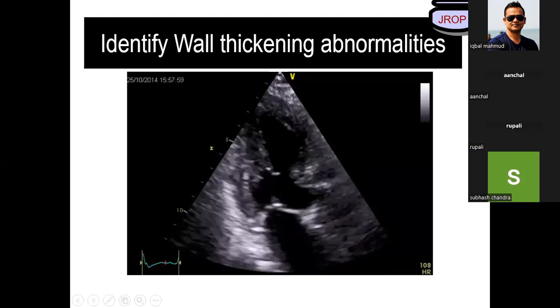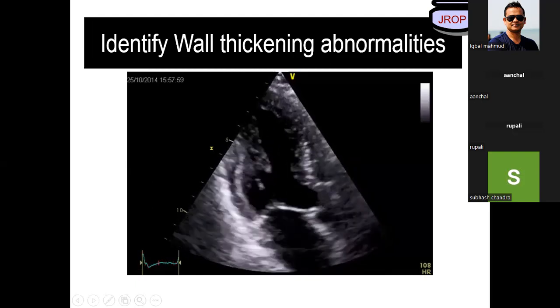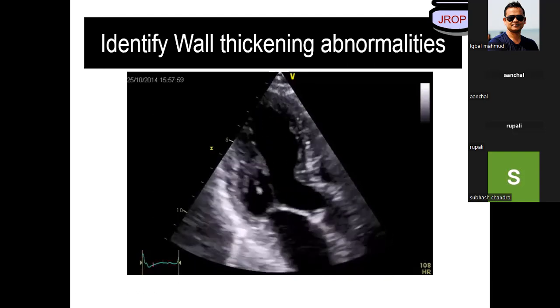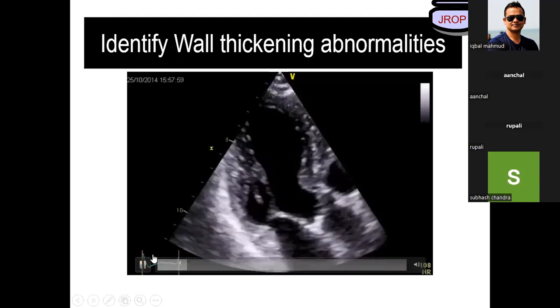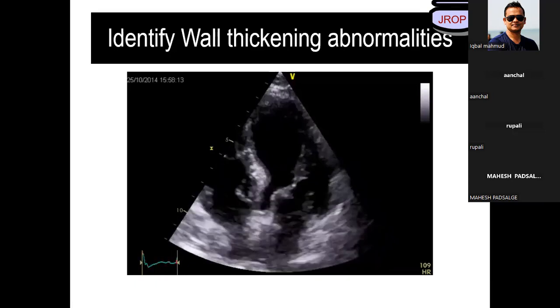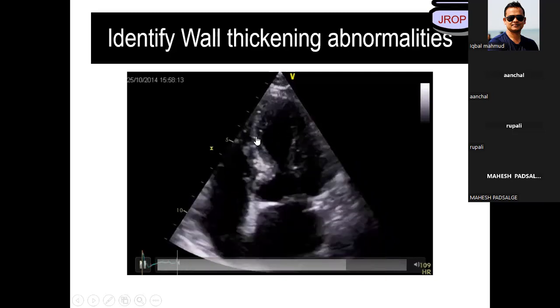Leave it. Probably. Rupali? Sir, it's LBBB or RBBB, jerky septal motion. Perfect. Rupali, God bless you. Thank you, sir. This is classical left bundle branch block. Look at the ECG gating, it is already there. How can you say it's VPCs? This image is so characteristic of LBBB. Now look at this over here, the septum. There's no extra beat out here. Only the septum is jerky.